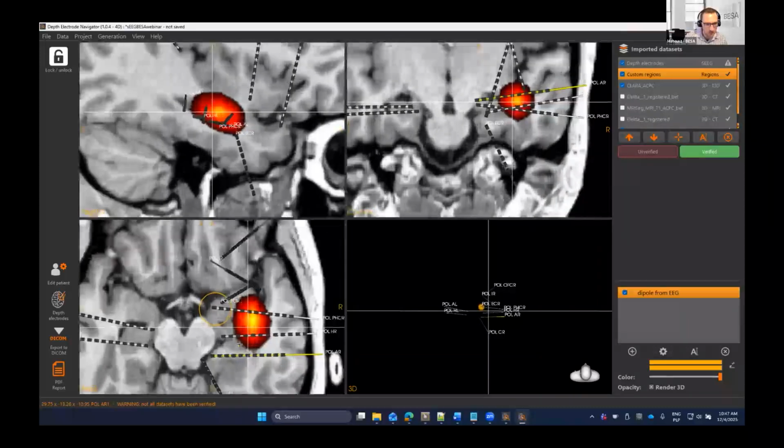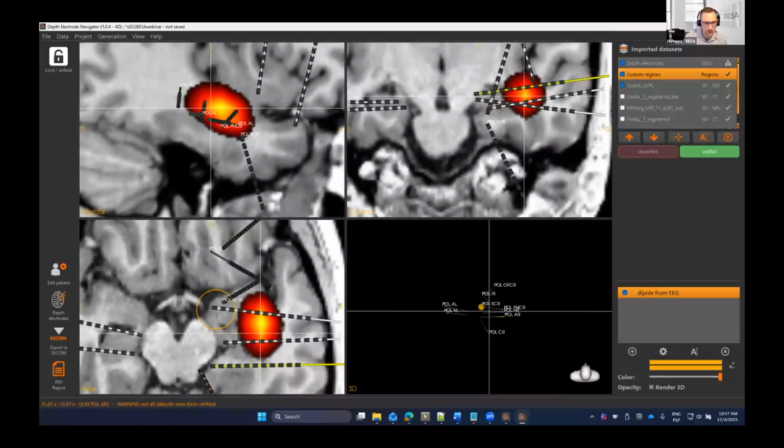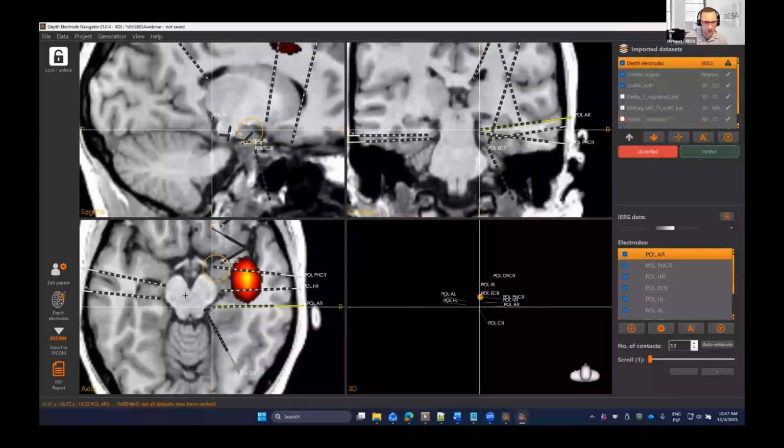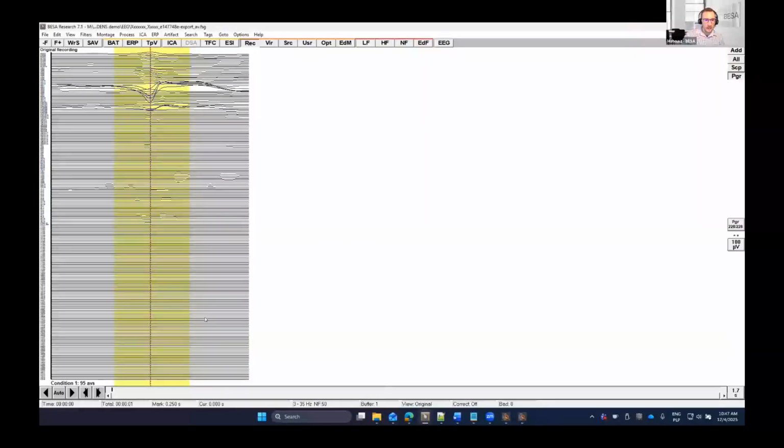dipole and Clara results are quite close to the results, but we can still load. We would like to see the actual data of EEG or sEEG on the data set. We are almost there to do that. But as you know, in the data set, we have much more. We have a scalp data.